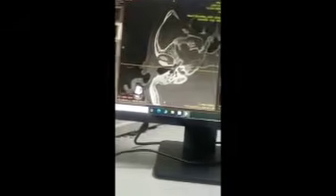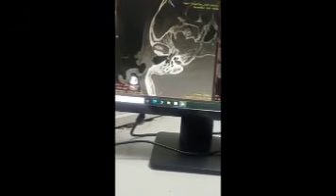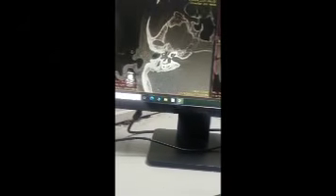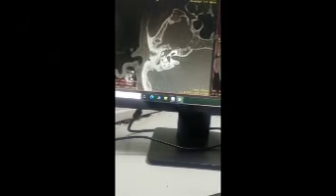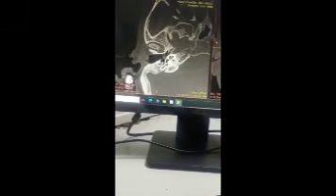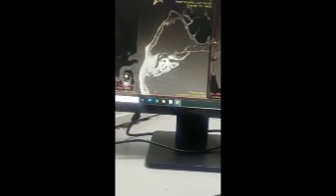Now the other things will be evaluated in the axial view. Okay, so now we will use the axial view for locating the inner ear. We will first locate the basal turn of the cochlea. Here you can see the basal turn of the cochlea very well. I will locate that for you here.